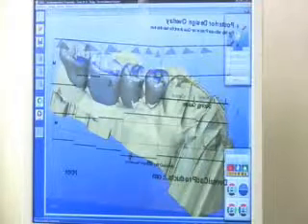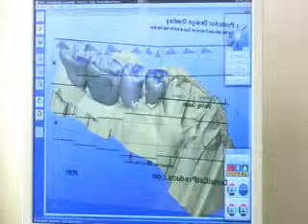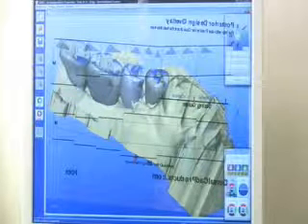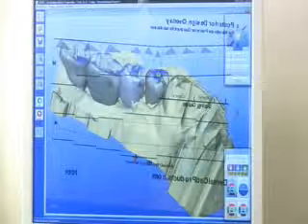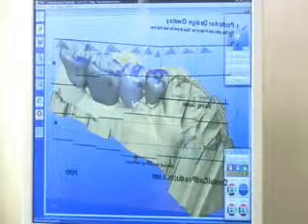After I've worked out the occlusion and the placement of the teeth, I'll refine the buccal and lingual surfaces and bulk up the connectors. Since it is a provisional bridge made out of plastic material, you're going to want to have substantial connectors so it can withstand the test of time. Form Plus, Form Minus, and Smooth are great tools to help with this.